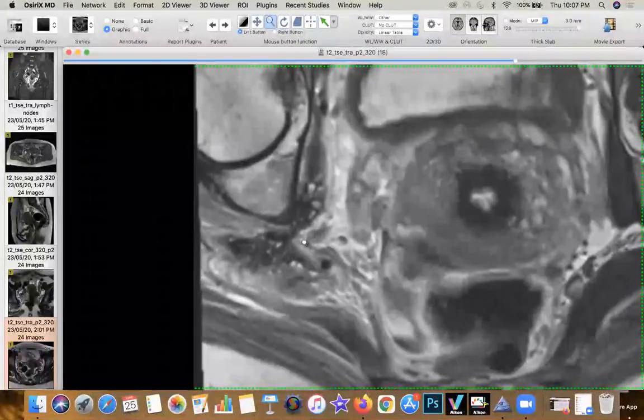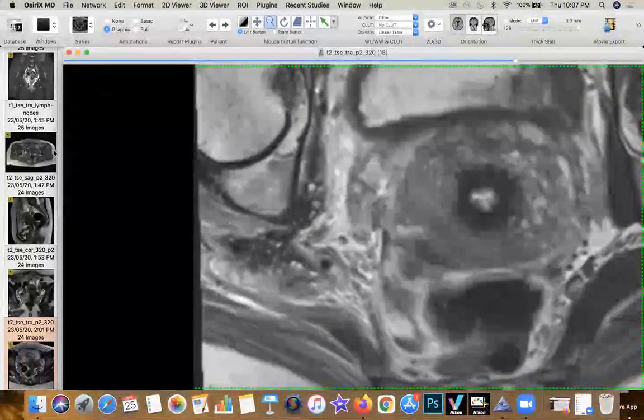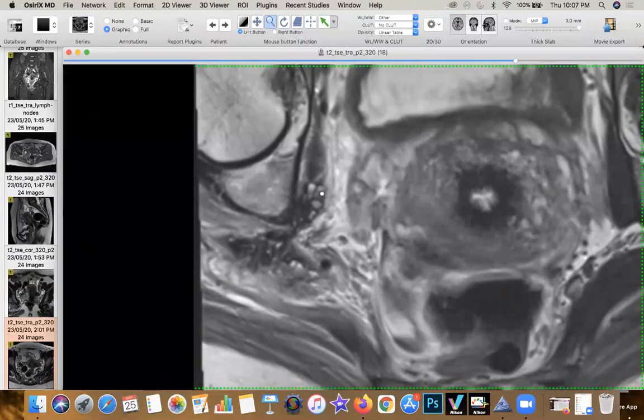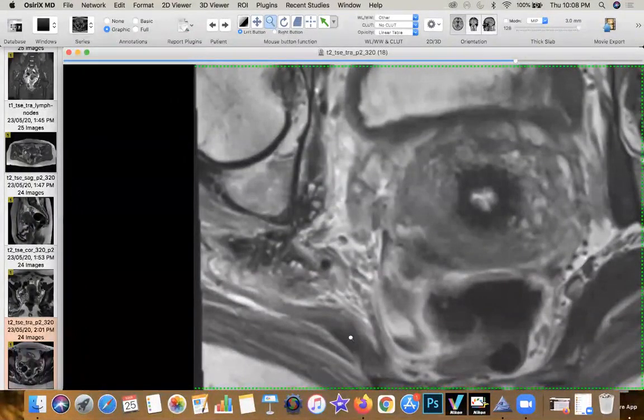So as I had shown you all yesterday, the lumbosacral plexus is a conglomeration of two major nerve trunks. The first one is the L4-5 lumbar plexus, and the other one is the S1 to S4 nerve plexus. So you have L4-5 and S1 to S4, and this is the typical location where you identify the lumbosacral plexus in relation to the posterior aspect of the obturator internus, posteromedial, arcing along in relation to the piriformis itself. So that's the left piriformis.